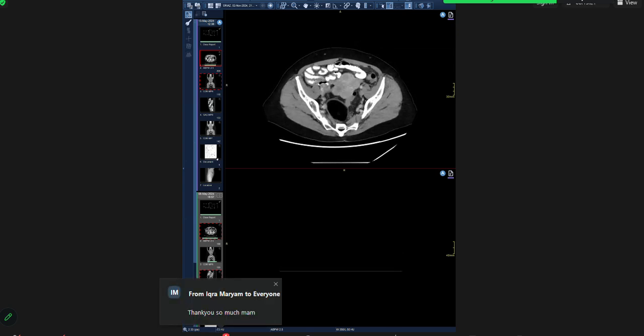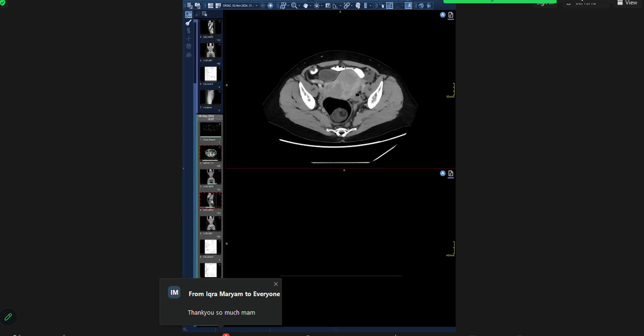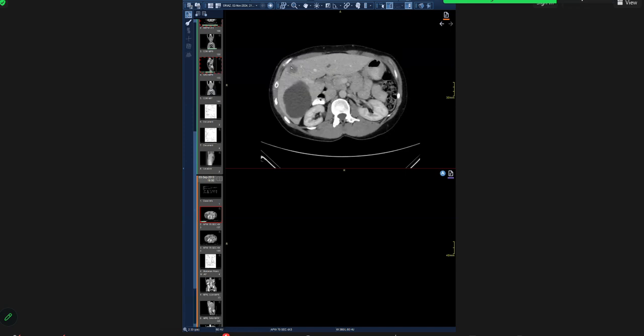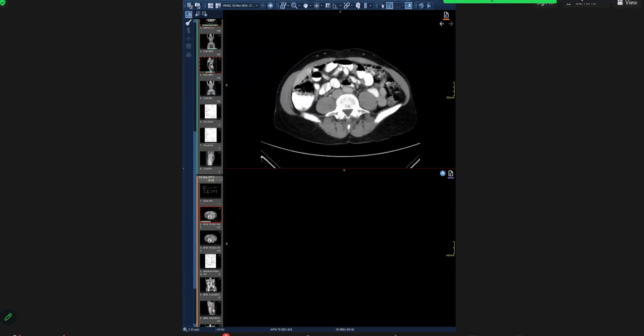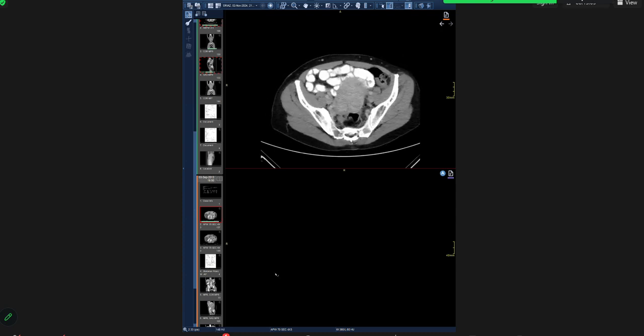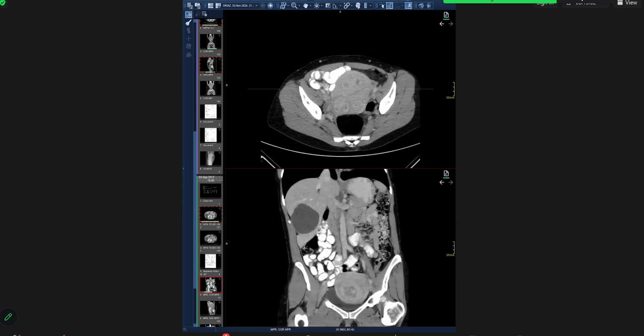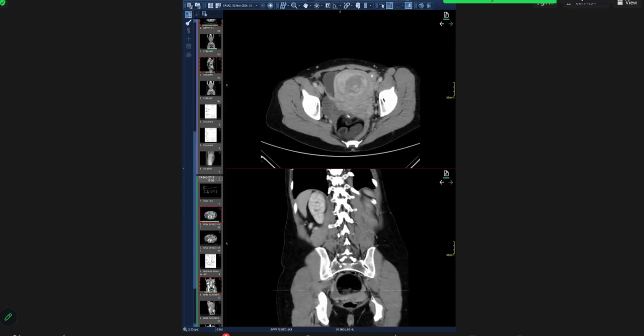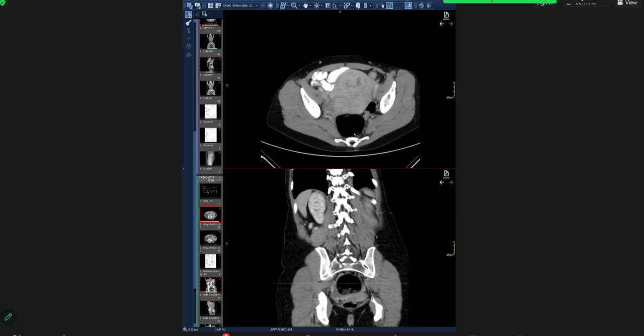Okay. So there is a CT from 2013. Let's look at this one. So this hemangioma was there then. So from 2013 till now, it can't be anything malignant. And where was the dermoid? Here, I'm trying to see. So that's her uterus. Okay, so this is the dermoid here. See the dermoid here? Sorry, this is Siri trying to get active. Okay. So see the dermoid here? So the dermoid's been there for quite a bit. Okay.